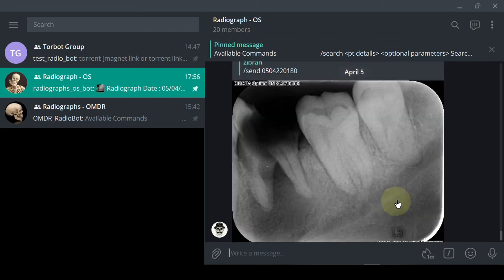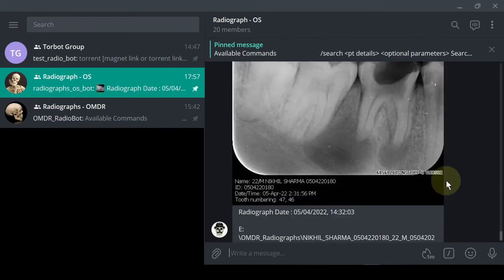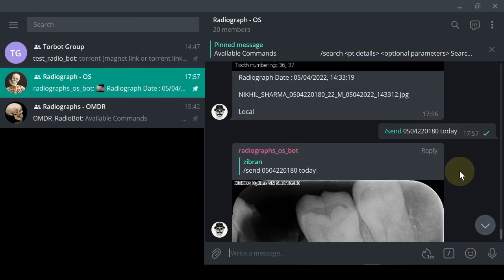Remember again, if we do send followed by today, if we include today in the search term, it is going to send all the radiographs of the patient that were taken today. But that is only for today.